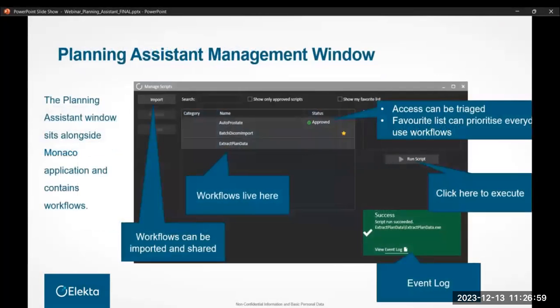We have also included a way to manage a lot of these scripts or workflows. This is a planning assistant window, which can sit alongside the planning system and create a nice, easy, accessible way for you to visualize the scripts or workflows you have available and run them easily. You can import and share these scripts as well. We actually encourage users to share these amongst the community.